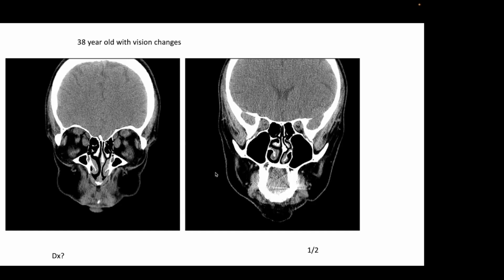I don't know. And what about the fact that you notice this muscle looks different than this muscle? In fact, if you look at the medial and lateral rectus muscles, they look different. Yes, they look different. And what disease do you think this patient might have? Maybe a thyroid problem, maybe. Exactly. That's exactly right.